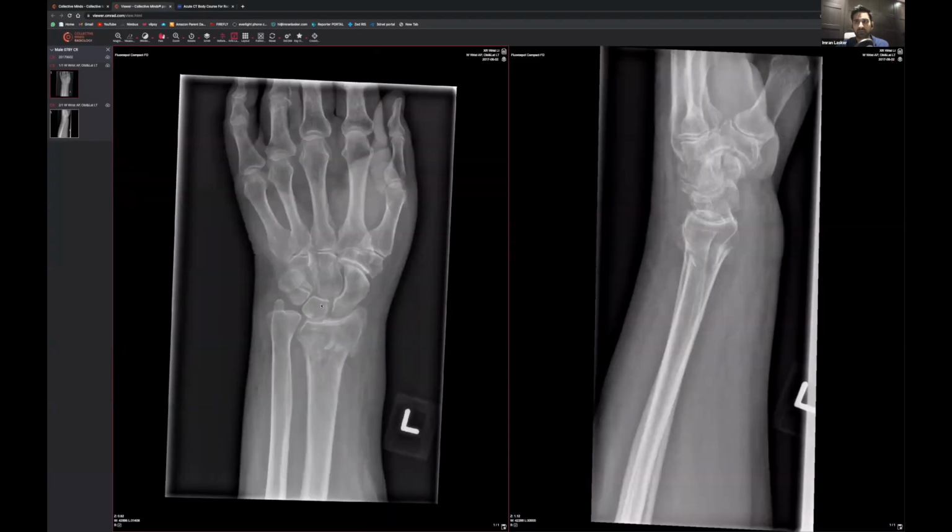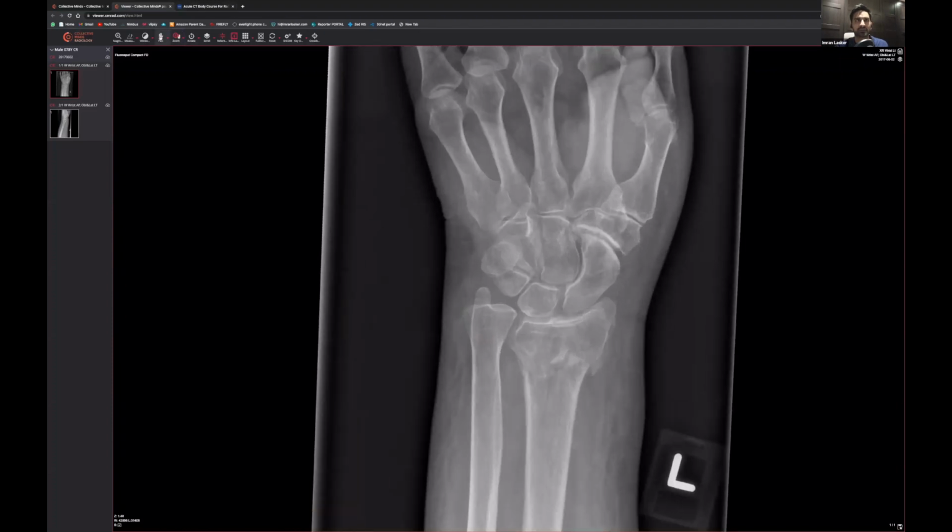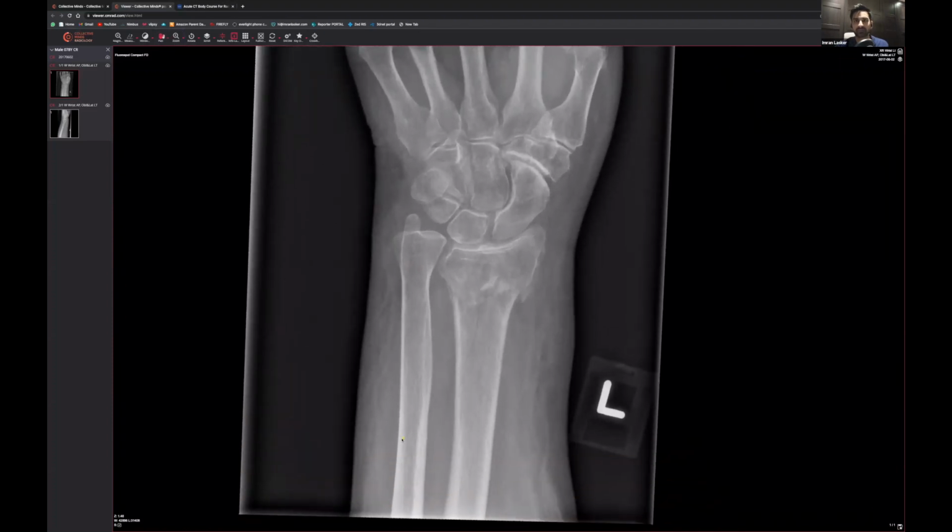So this one, pretty easy, right? One would hope. Hopefully everyone can see that. Please feel free to throw in what you think. But what we'll do, we'll have a look and just make sure that we can all see this fracture and we all have a system. So yes, we kind of go along like this, and the ulnar looks okay.